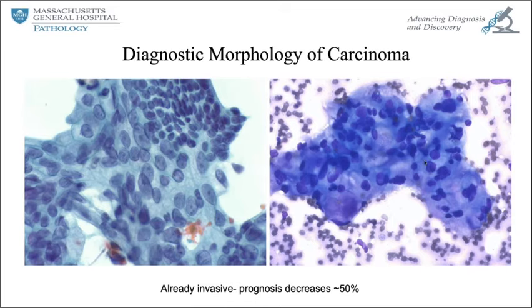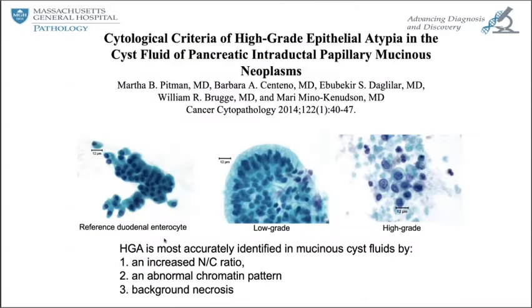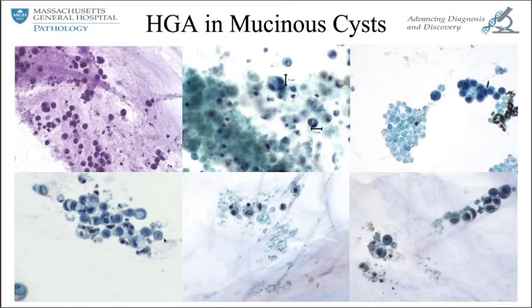Once again, it goes back to your multimodality approach, where it would be beneficial to see the endoscopist report and add it to the ancillary testing and so forth. But you're still looking at these cells morphologically. If you're saying this is cancer, this is adenocarcinoma, then don't hesitate, just make that diagnosis. But what I wanted to impress was that cells like this could go either way.